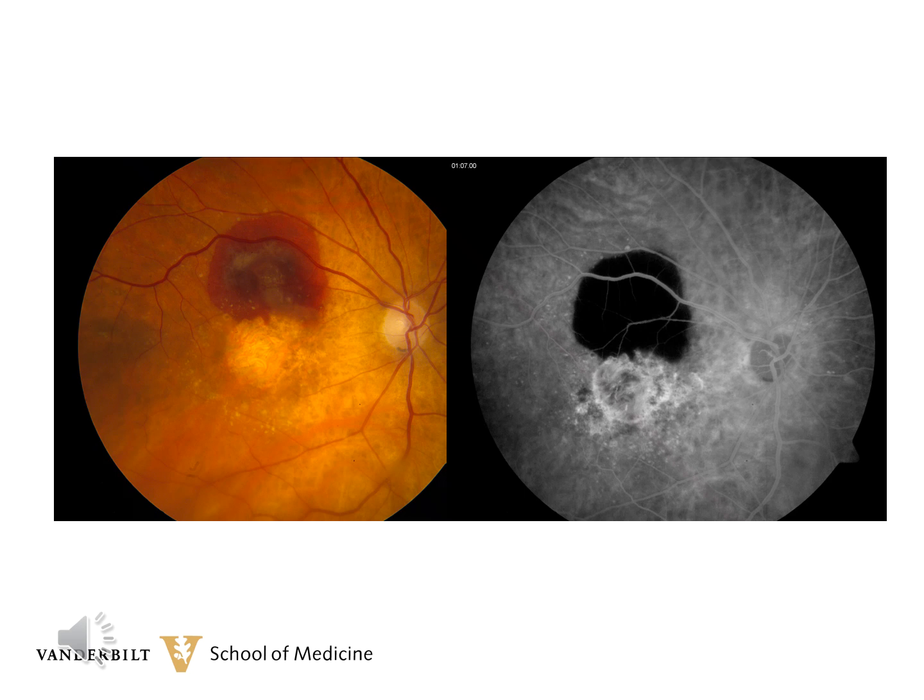The fluorescence of the retinal circulation can be seen quite easily over the hemorrhage, but the hemorrhage blocks the dye and all fluorescence from the choroid. There's a window defect inferiorly, and this corresponds to the atrophy that you can see on the color photograph. And then also there are punctate areas of hyperfluorescence, and these are secondary to the staining of the retinal drusen.